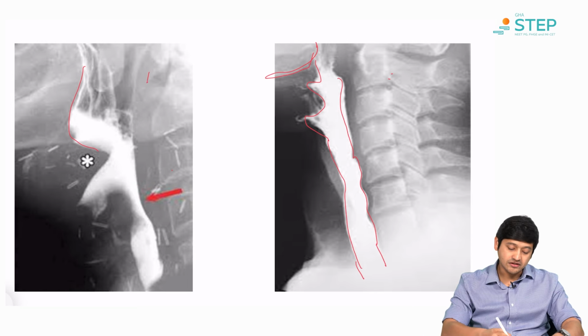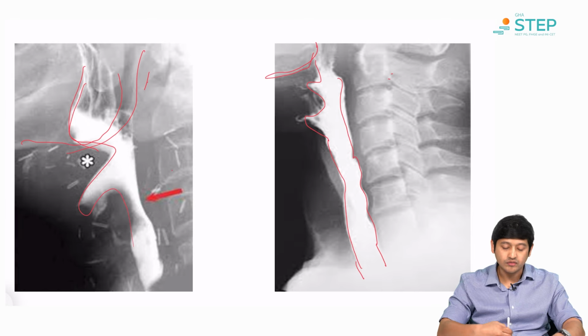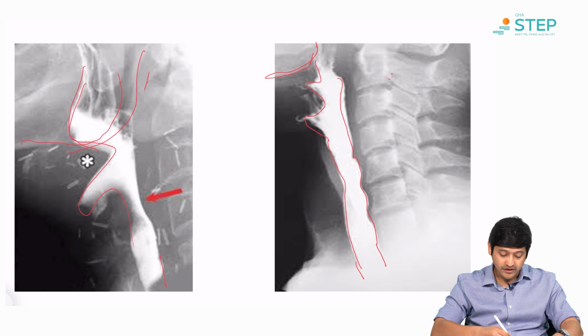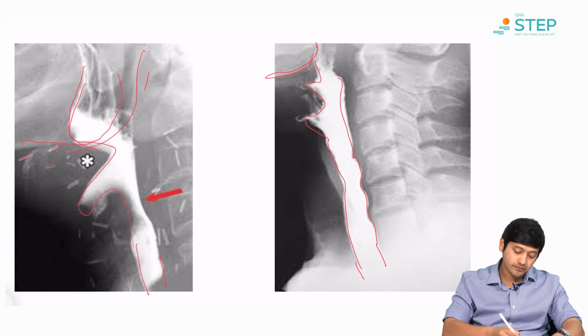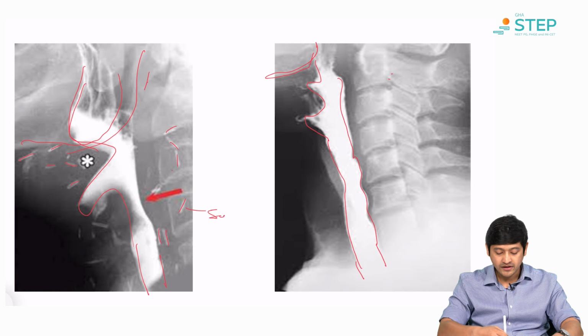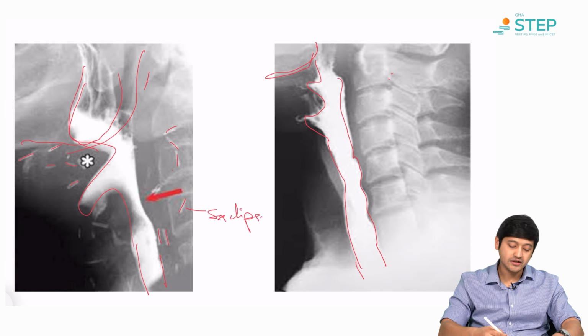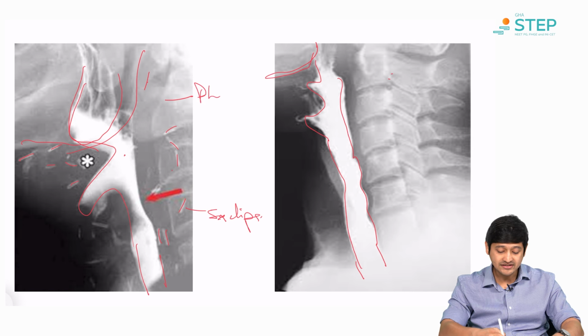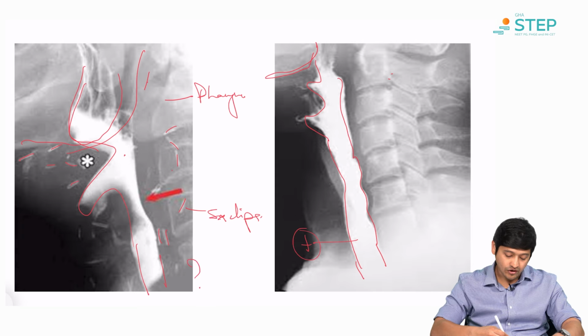In the image given to us in the question, you can see much more of the mandible over here. Over there, you can see that this is outlining what we think is the pharynx, and we don't actually see the distal parts of the esophagus. What you also see is multiple hyperdense or radio opaque structures which are possibly surgical clips. So, surgical clips here, you see a hyperdense content within the lumen of the upper GI tract. So, this is probably the pharynx. Alright, you don't see the distal part of the esophagus. It's present here, it's not present over here.